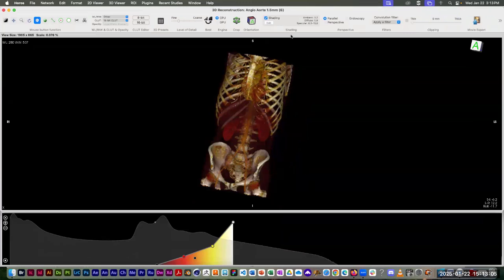What happens is the image up the top gets a little smaller, and we get these little graphs down at the bottom. And there are two different graphs down here at the bottom. In the background is a grayscale graph, it's a histogram, meaning that the height of each part of that little graph, that little grayscale mountain range in the background, the height of the line is telling you something.